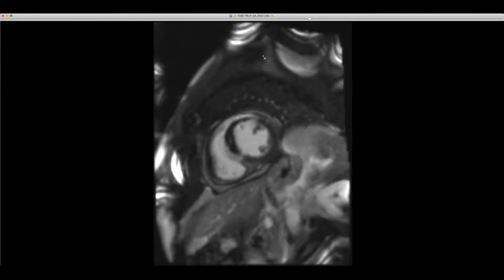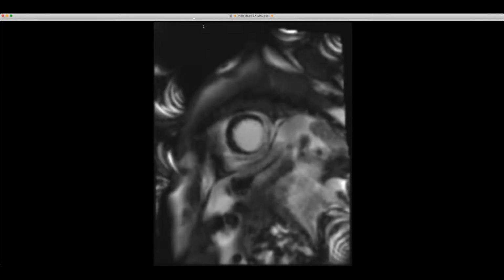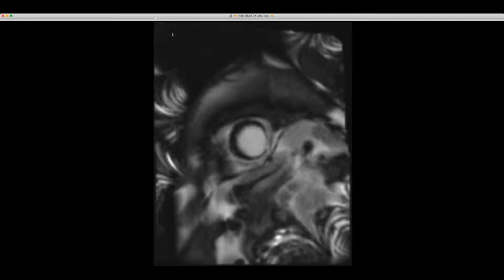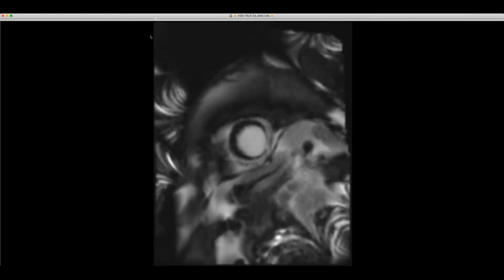The history is this patient had a very recent MI, a subacute MI over the last week, and had developed this microvascular obstruction. So it just shows you that this can occur within just a short period of time of a myocardial infarct. So we had edema, suggesting the acuity of this, and then we have a large area of microvascular obstruction. So I just thought that was a really good case of it. Okay, I may do one last one.